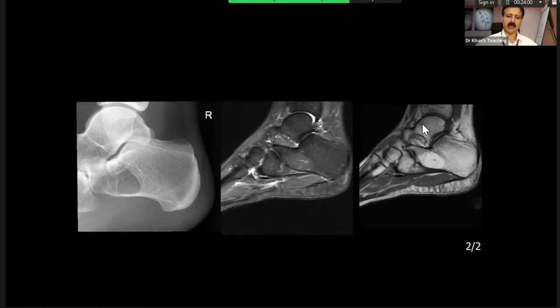It can be what we call hemophilic pseudotumor, calcaneal, that is there. Known site, and it has come in the exam quite a few times. Brown tumor of hyperpara, this is another one. So there is quite a favorite location for a specific differential, as I have told you.